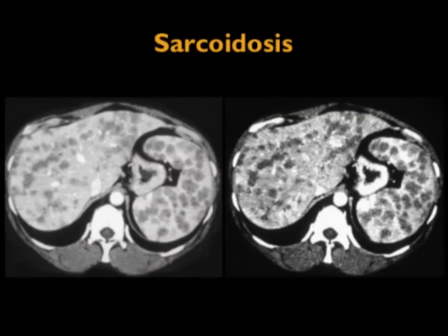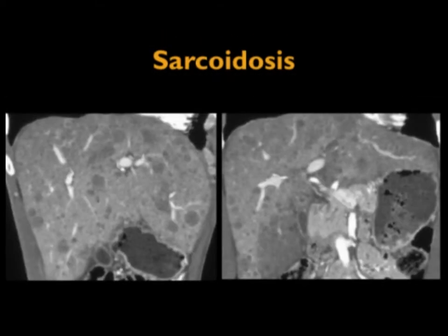Good examples, you look at this case, you say, wow, this looks like metastatic melanoma, lymphoma. Well, this was sarcoid. The patient was relatively asymptomatic. I always make the point, if you see a disease, another case, and it really looks like you have widespread tumor, patients will be sick, will have weight loss, will have symptoms. When the patients are relatively asymptomatic, when they got a scan, maybe for trauma or some very minor reason, then you better be thinking about sarcoidosis.